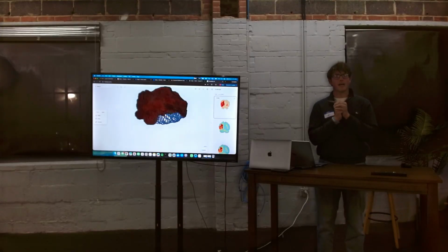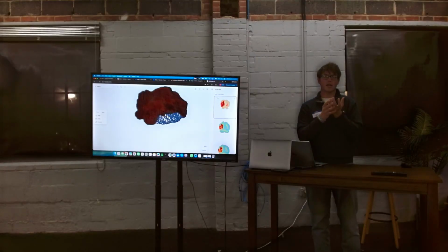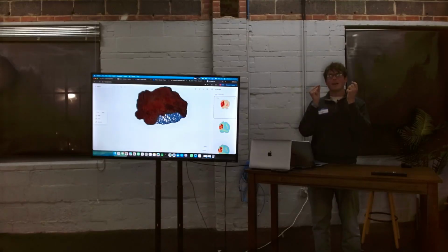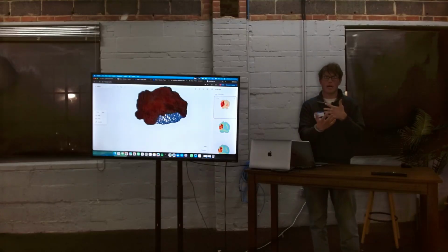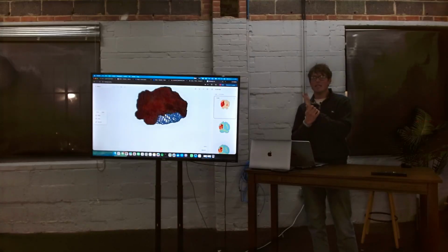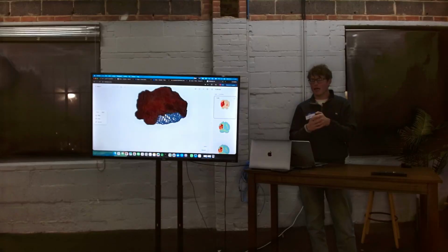I think one thing that I forgot to announce is, when it comes to medical imaging, SAM3 is trained on data from everything. It's not fine-tuned to be very accurate on medical images. That's just a very small amount of what it's trained on. So when you try to describe something in a medical imaging context, it's not going to perform that well. If I just say tumor, it's not going to know where that is. Maybe it will if it's trained on it. So the idea is you need to create training data and then hook it back into this and then kind of iterate.